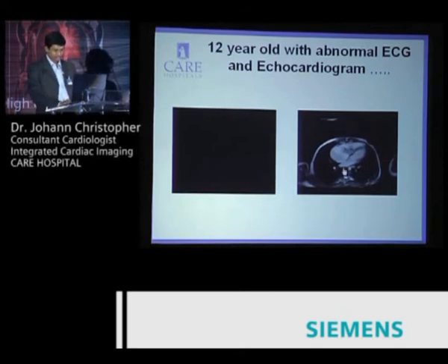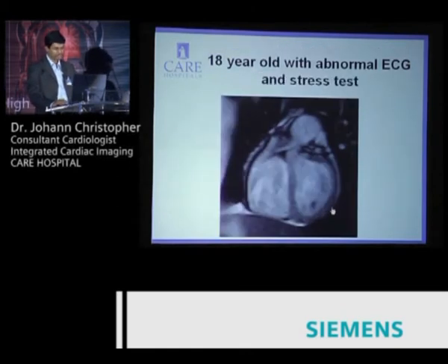We are actually able to see the septal leaflets which are far below into the RV, and also the flow disturbance. And this is an important calculation by which we send patients for surgery. This is an 18-year-old boy with chest pain on exertion. He does some track and field work, and he had an abnormal ECG. His treadmill was abnormal, and we did find an anomalous right coronary coming from the left coronary sinus, passing between the MPA and aorta.